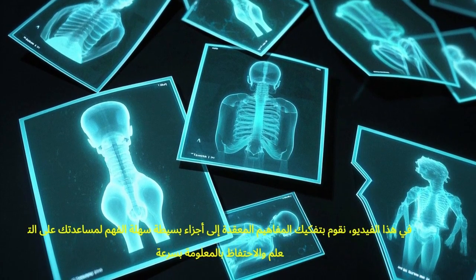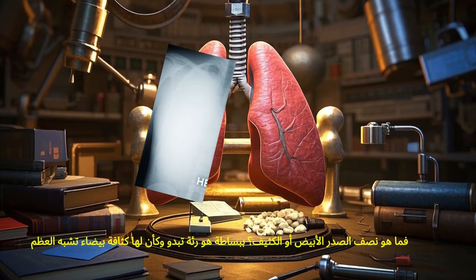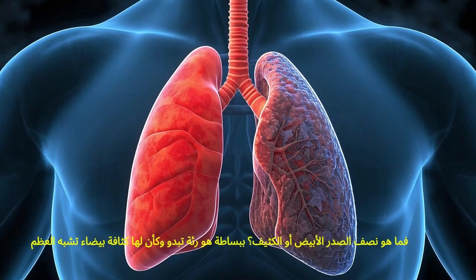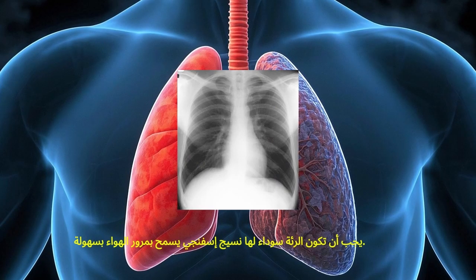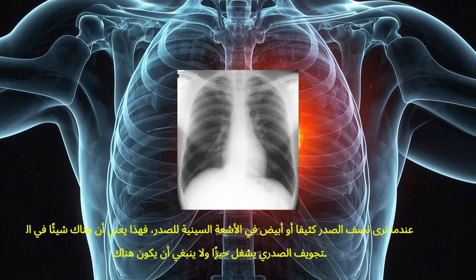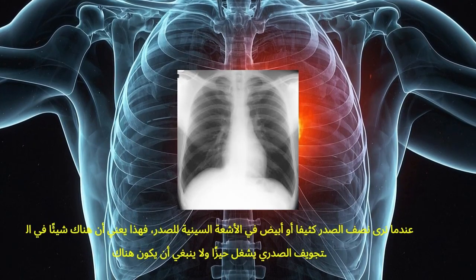So what is an opaque hemithorax? Simply, it's a lung that looks like it has a white density similar to bone. The lung should be black, have a sponge-like texture which allows air to pass through easily. When we see an opaque or white hemithorax on chest X-ray, it means there's something in the thoracic cavity or in the lung tissue taking up space and shouldn't be there.